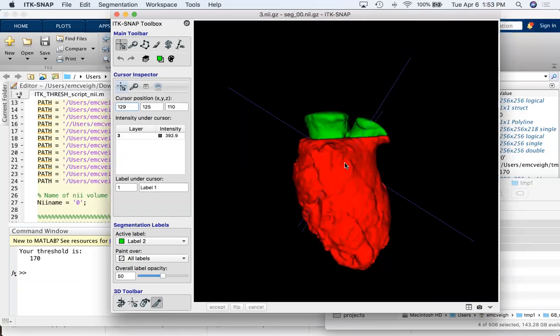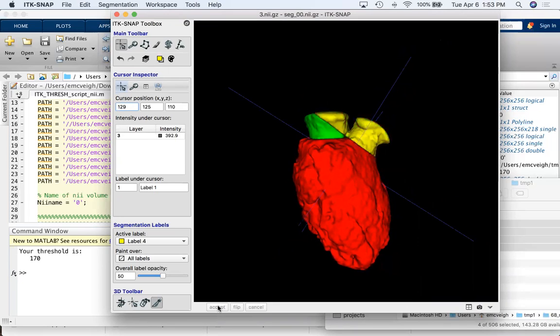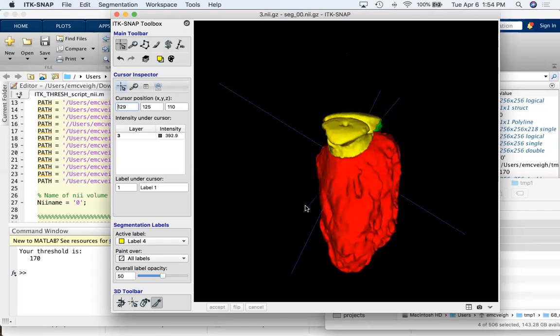And this is sort of, I want to say, a skill. So we're going to call this 4, and we'll start here and we'll go to there. And we're going to call everything above there 4. And then we can rotate, oops, there's my mouse. Rotate around and make sure it looks symmetric. It looks pretty good.